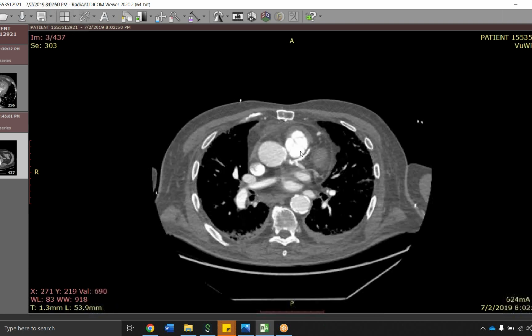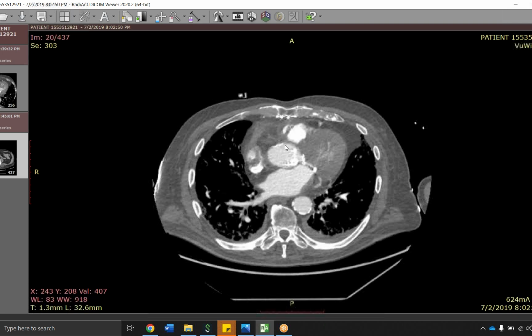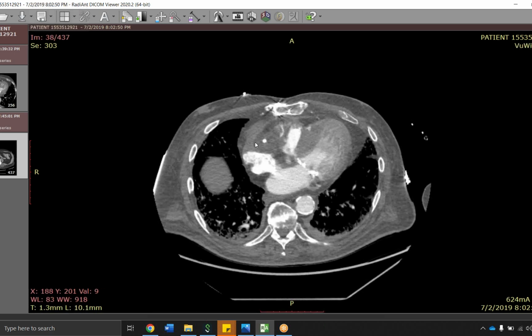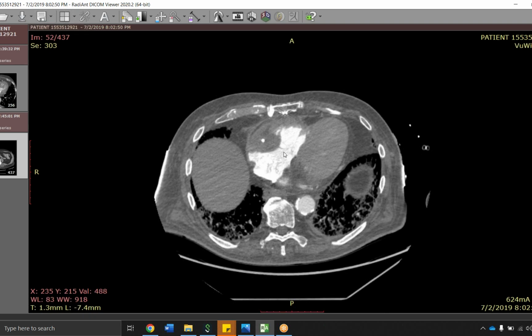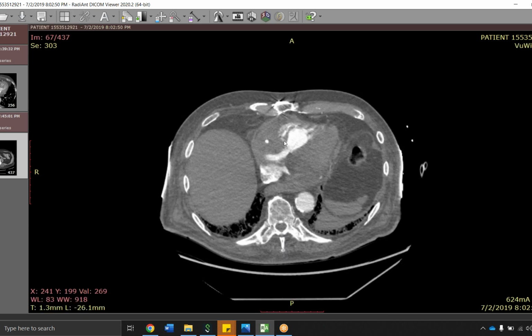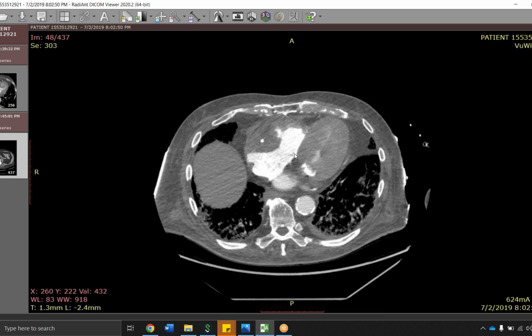But the abdominal CT caught the heart, or at least part of the heart, and around that RCA, which now has a stent in it, we see this large amount of stranding and hematoma in the area where they did this percutaneous revascularization of this total occlusion. When they do these, they're poking with the wire and obviously can get outside of the expected course of the vessel and cause this hematoma around the area.